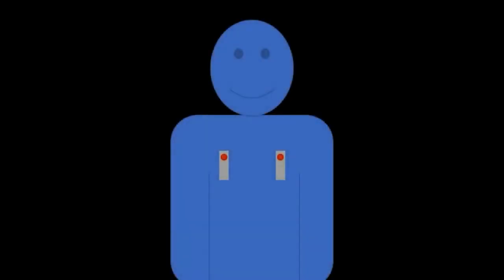This cartoon depicts the placement of our probe for evaluating the pleural line in a supine patient. Both the Butterfly and Philips handheld machines can be used to obtain these images. The red circle symbolizes the indicator and should be positioned towards the patient's head, therefore taking an image through the short axis of the ribs and into the thorax.